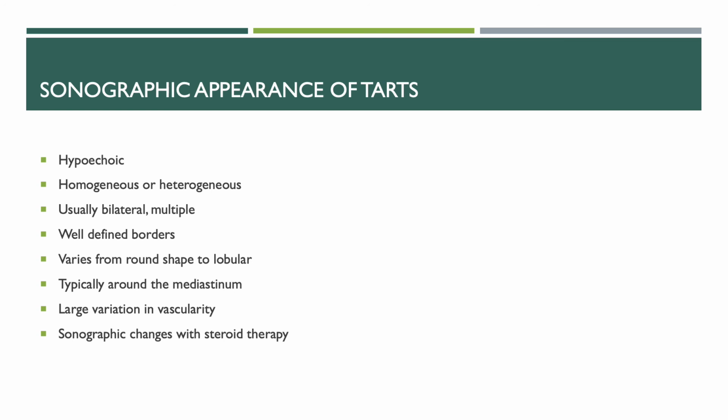Usually, if a patient is diagnosed with congenital adrenal hyperplasia and has masses like these in their testicles visualized on ultrasound, this is diagnostic. Following with ultrasound is recommended. The masses will also decrease in size with steroid therapy.